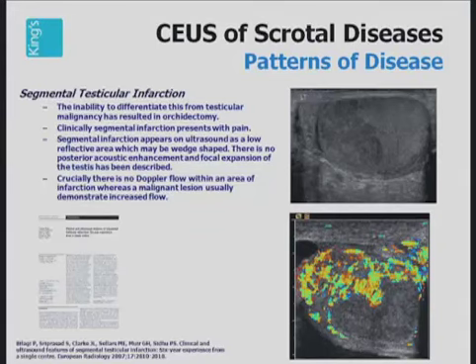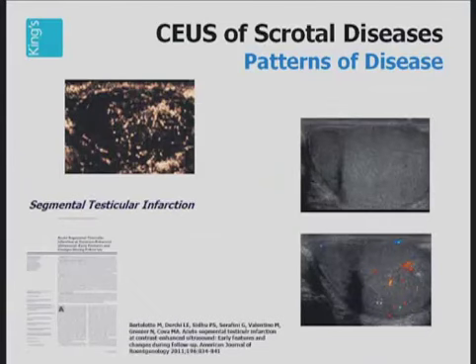However, there is no color Doppler flow to that area, and there is confidence that this is unlikely to be a tumor. Adding contrast at this stage allows the physician to clearly identify an area of infarction and to manage this patient conservatively.